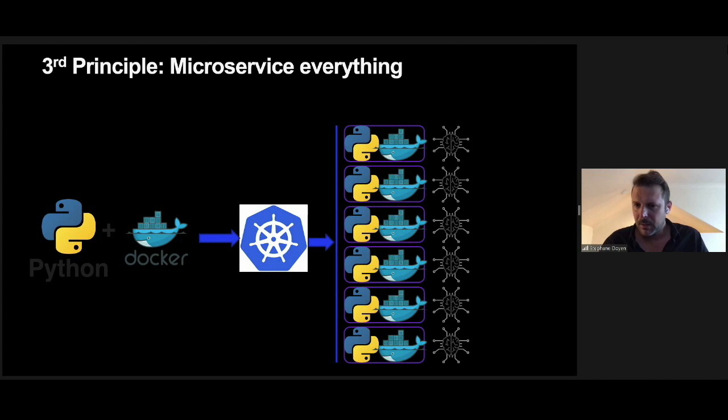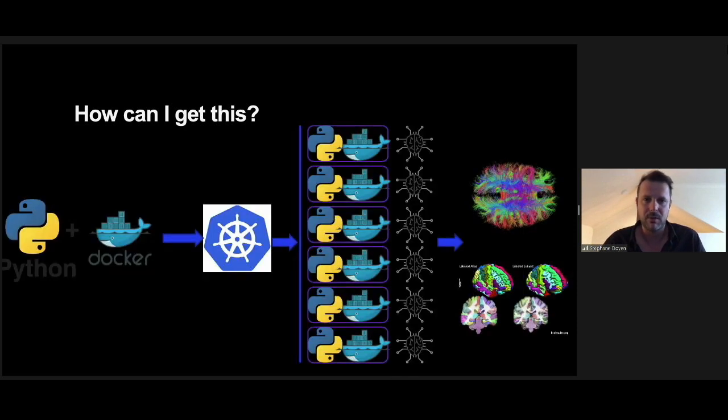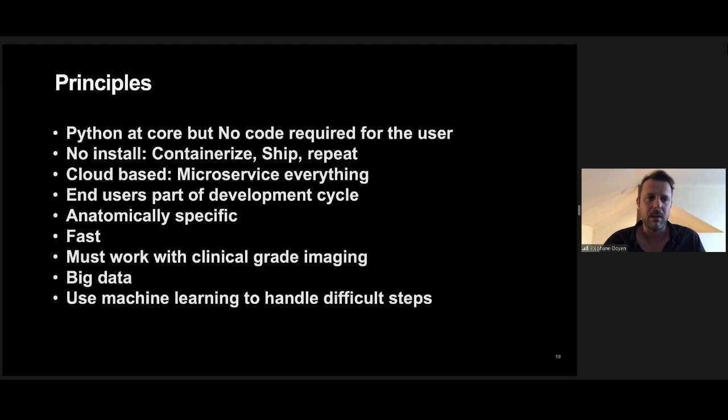So I'm going to go back to my initial question, my initial quest: finding a way to get this DTI tractography imagery and this amazing brain mapping available, with the least amount of coding or technical specialty, to Michael Sughrue and following the public. Well, my answer to this was, basically we have to shift gear here, and we have to build this cloud platform using modern software architecture. So these are just 3 principles we apply here, but obviously there are a lot more, and you'll see that throughout the demo. And some of which I'm listing here, which we found essential for us here at Omniscient.